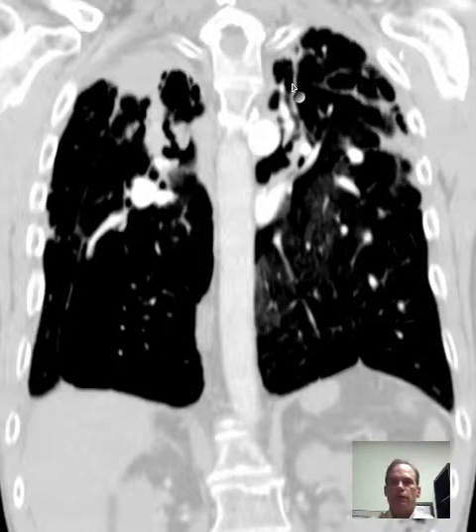So pick up on the terminology that I use so that you can converse with it, and instead of looking at something like this and seeing what's wrong and seeing where it's abnormal, you acquire a vocabulary for lungs and hila. So this, you could say the hila are up too high, but the proper term would be hilar retraction.